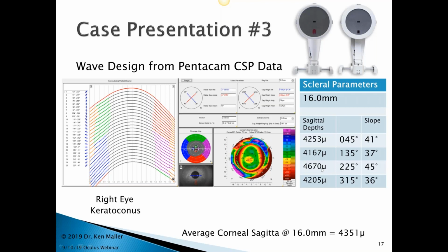It's again another 300 microns of sagittal depth that's occurring down in that one particular area. And of course, on this screen, we can actually see where the cone is on this particular eye. And you'll notice also my coverage map looks very, very good. And this is just owing to more and more practice in getting maps. This was one of the later maps that were done in this series of 3 cases that were presented.